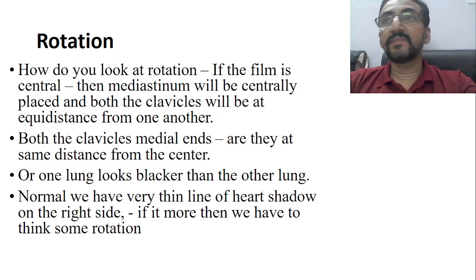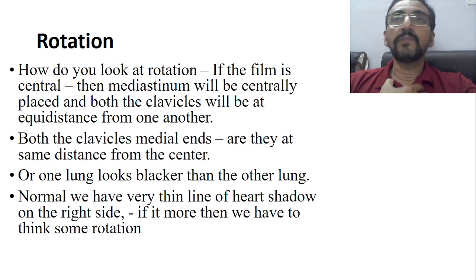If the film is centrally placed, what are the identification marks? Then the mediastinum will be centrally placed, isn't it? So the mediastinum will be central, and both the clavicles will be equidistant from one another, equidistant from the central line of the sternum.